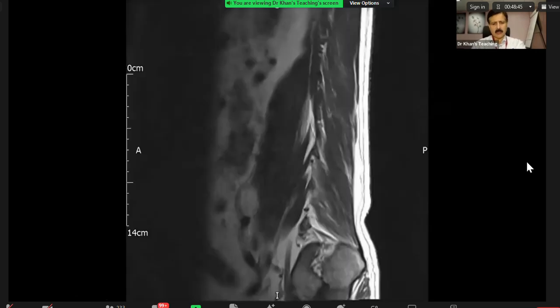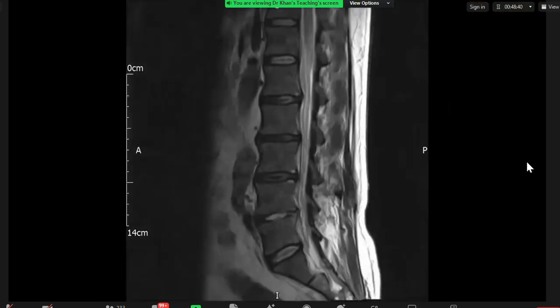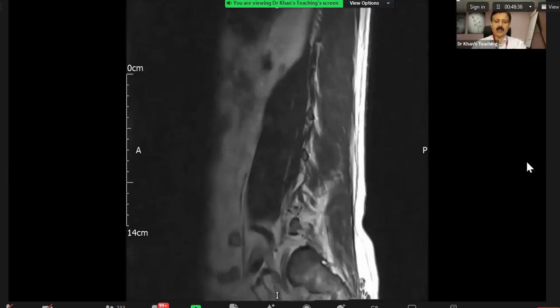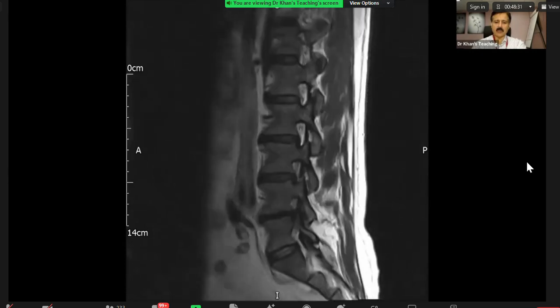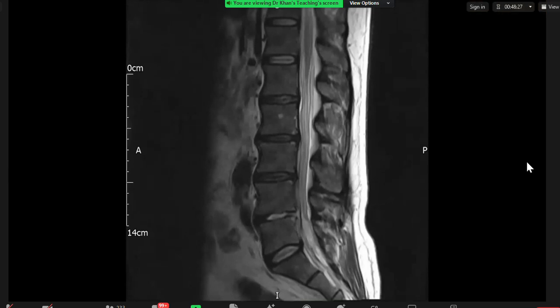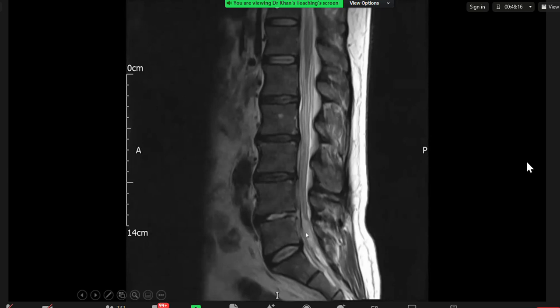Keep going. Okay. So this MRI is T1 weighted. T2. This is T2, sorry. Can you go to the midline, please? Just midline where the cord is visible. Just stop here. Now, regarding the Cauda equina, what do you think? There is increased signal in the Cauda equina nerve roots on the sagittal image here. Right? Agreed?